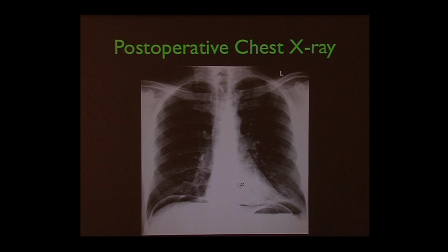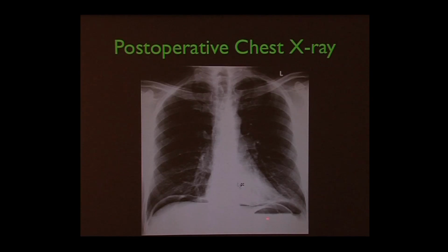Do you have any idea what position this patient was in at the time of this x-ray? I mean, upright or lying down? Standing up, because we have an air fluid level. So that's how I know. This is air, this is fluid, and this is an air fluid level. So the air rose up because the patient's upright.